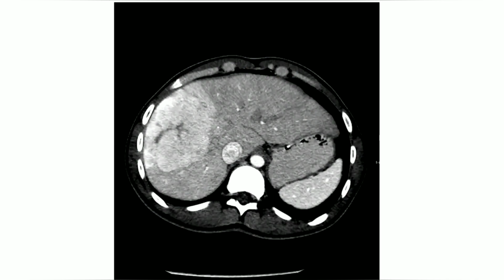Next, you can see it's enhancing, but there are different types of enhancement. Enhancing can be hypovascular enhancement, such as lymphoma or hypovascular metastasis, or hypervascular solid liver lesions such as FNH, fibrolamellar HCC, neuroendocrine tumor. You need to emphasize the pattern of enhancement. So the background liver is not cirrhotic, and there is a large hypervascular liver lesion in the right lobe, and we can see this central scar.